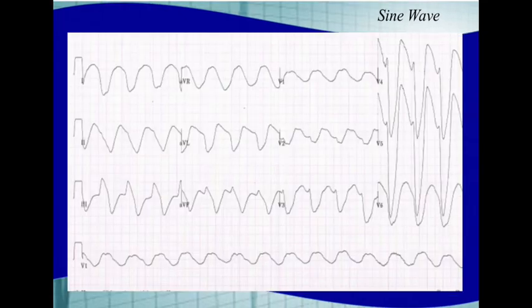And you can see it on a 12-lead EKG of a severely hyperkalemic patient. And when I say severely hyperkalemic, this patient is about to die. If they are not emergently treated, if that serum potassium level is not emergently corrected, they will go into cardiac arrest and die. And it's going to be a difficult arrest to work. There are treatments, of course, for hyperkalemia. This patient did not receive their regular treatment of dialysis, which would have lowered their serum potassium level.